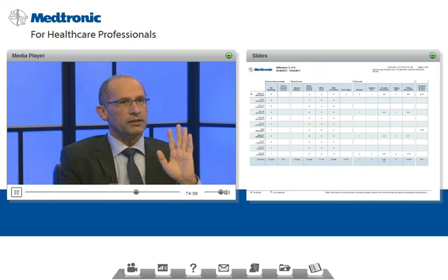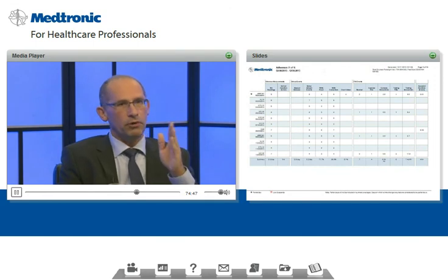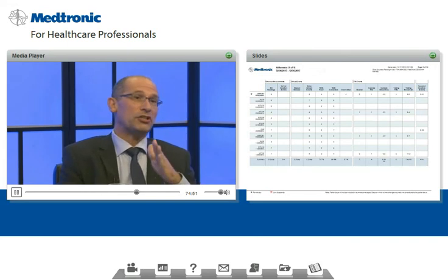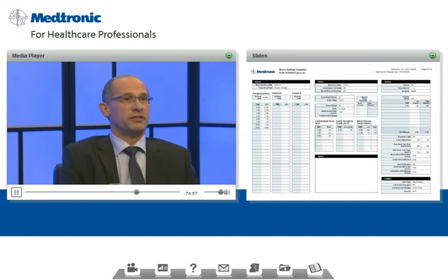And let's look at the adherence report. Is he measuring enough? Is he bolusing enough? Is he bolusing according to the plan? Is he changing the consumables enough? Those are the questions you get from the adherence report. And then, this is the setting.